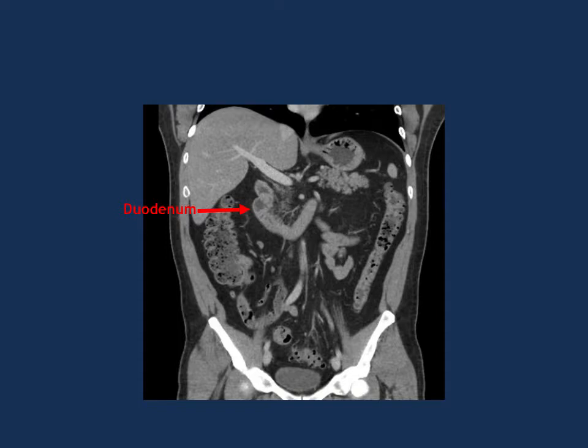Yeah, that's really great. And here's the cecum and the ascending colon, and on the left side you can clearly see the left colon. And then you go down a little further, it's going to be coming in and out of the planes because these are cuts. You see the sigmoid colon. Yeah, and in that sigmoid colon, if you look at those little bubbles, since those are on the bowel wall, those are actually diverticula. You can see it on axials pretty well as well, but you can clearly see those little bubbles. Those are diverticula there.